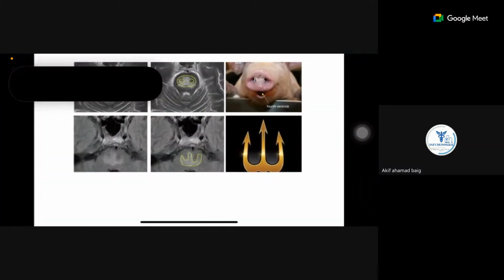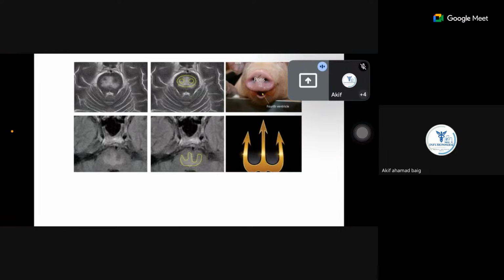So this is an osmotic demyelination syndrome related sign, which is known as the trident sign, where you see a trident-like structure in the pons. It's also known as the piglet sign. Medicine examiners generally tend to ask what you see in and out. So what is the bread and butter? Stroke, dyselectrolytemia, and some syndromes and some infections. They don't generally go beyond all that.